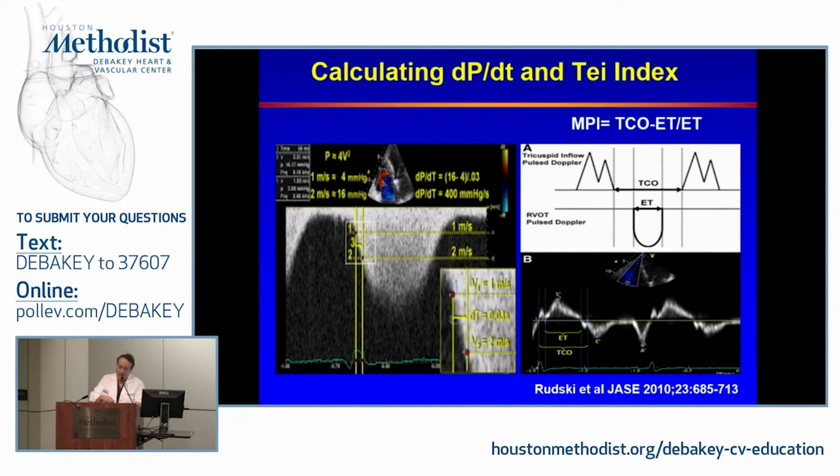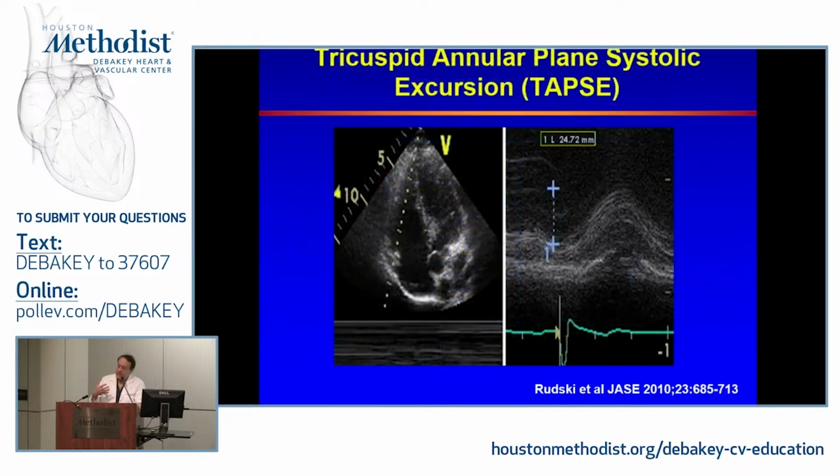Is this reflecting what is happening throughout the ventricle? The second thing, the normal values are not interchangeable. The upper limit of normal by this method is 0.54, whereas here it is 0.43. Of course, machines can do that automatically, and they can present you with all these values so you do not have to struggle and go after them.